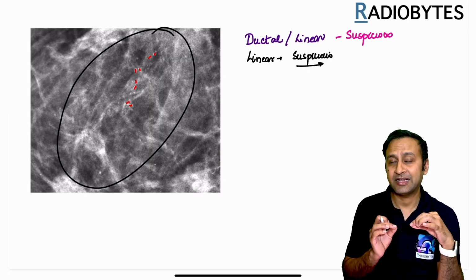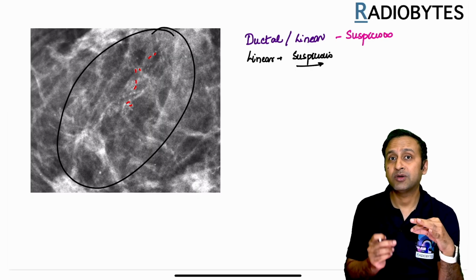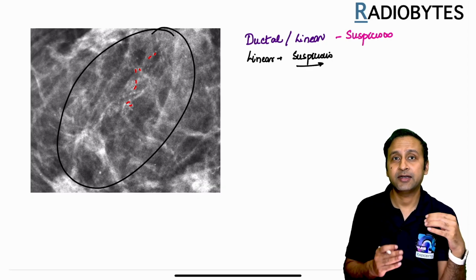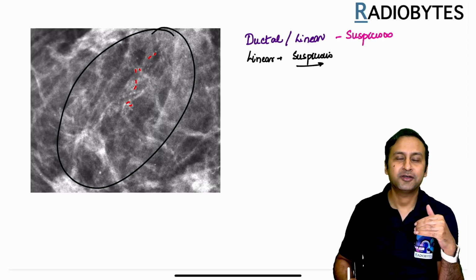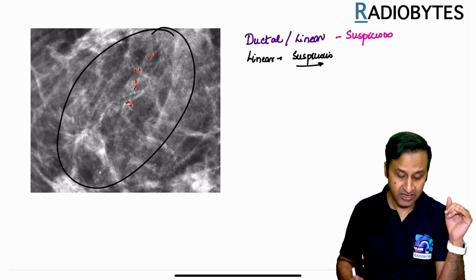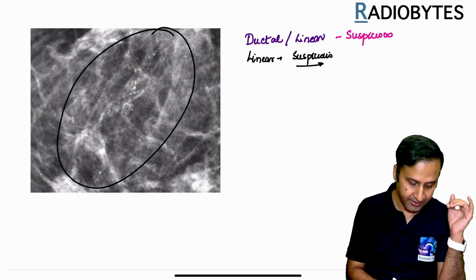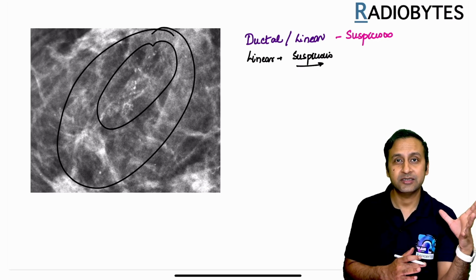When we have a calcification which occurs in case of tumors, it results in formation of tumor cast inside the ducts, and these tumor casts would form calcification over their surface, and they would conform to the shape of the ducts. This is the reason why majority of the ductal carcinomas in situ, without even presenting as a palpable lump or a mass, can present in this pattern of distribution. So just keep a pictographic image of this particular case in your mind. Whenever you see this pattern of distribution with or without a mass, it is always suspicious.